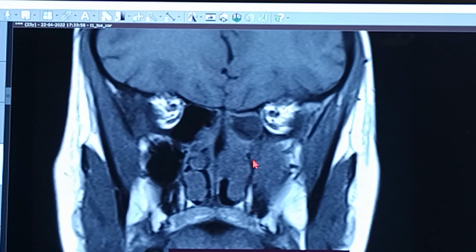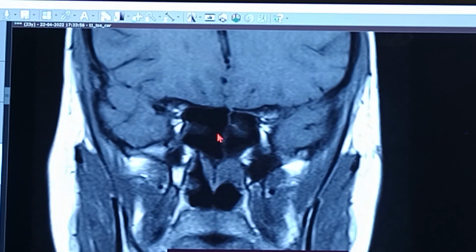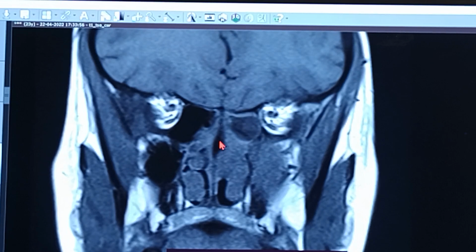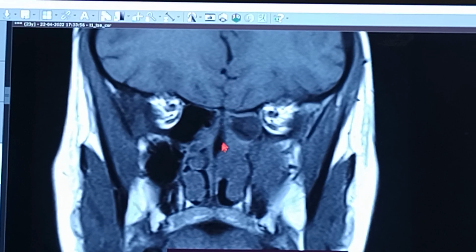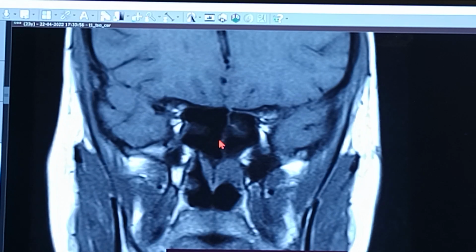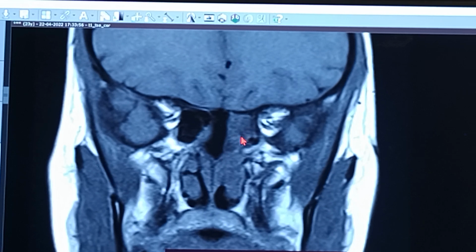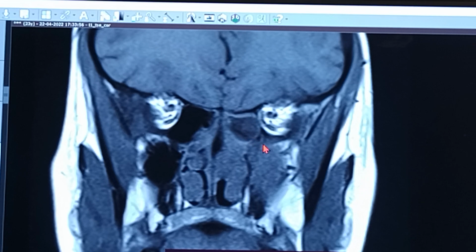This is the lateral bony wall of the nose, this is the air column, and that's the bony septum in the midline. If we keep on going behind, you can see the sphenoid coming up in the picture. This could be a part of the rostrum of the sphenoid as well, but less likely, this could be the spine of the nasal bony septum. So that's the skull base. The skull base is completely intact, nothing to worry about in that sector. That's the sphenoid. Beyond this, everything is normal. This particular area is of more interest, and this pocket of pus right here, which is in close approximation to the orbit right there.